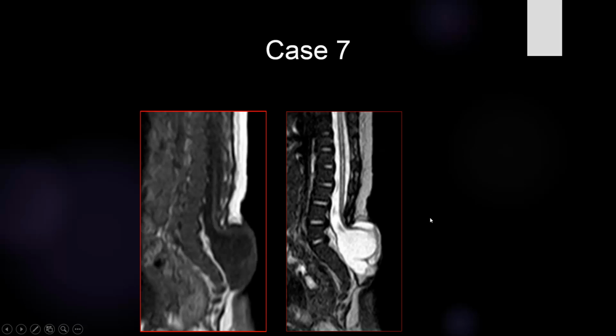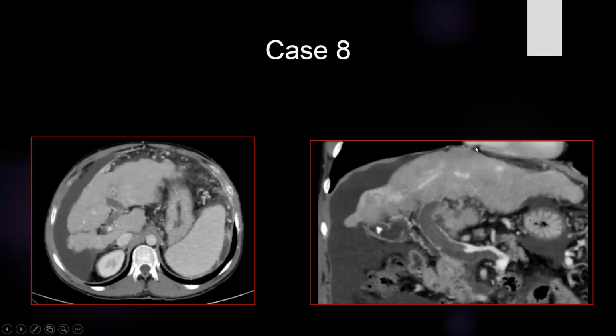So this is a typical case of lumbosacral open spinal dysraphism. We must localize the dysraphism. We must say the location or specify the region of the lesion. We should say this is a lumbosacral open spinal dysraphism or myelomeningocele.